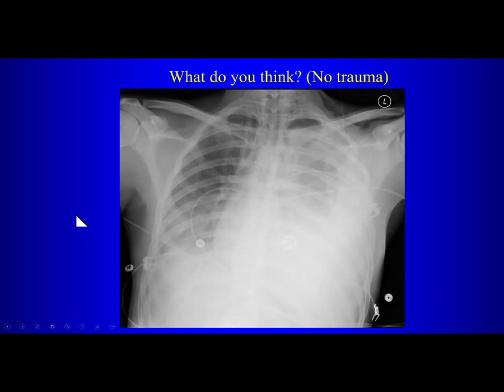All right, so for this patient, what are the findings on the chest radiograph? Well, what do you think that is? Yeah, there's a large opacity here, right? Okay. What is it? Well, you're going to have to tell me what you think it is and why. First of all, is there any other finding that concerns you? There's subcutaneous air. Yeah, so there's air here, right?